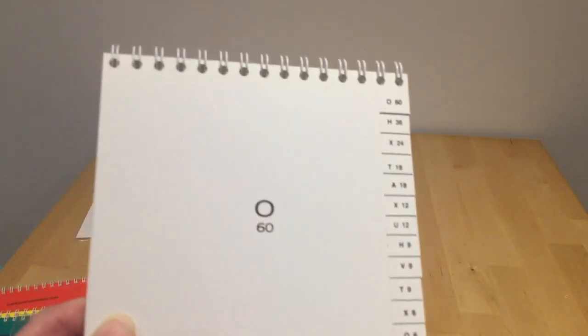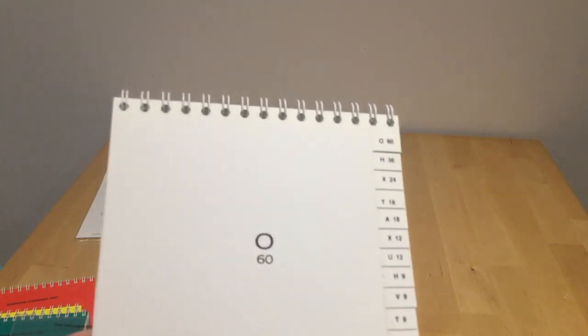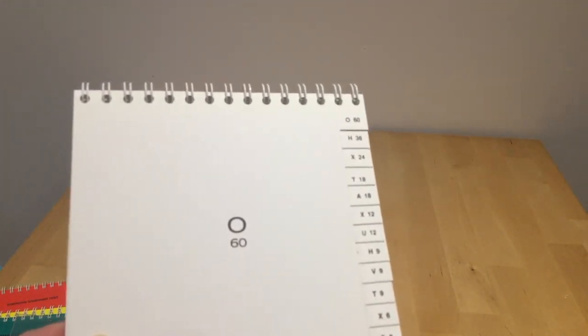So if you don't have very good visual acuity, and you're only going to have one opportunity to guess the letter at 36, it's perhaps quite a crude and blunt instrument to assess distance vision. But that's it. It's the reduced Sheridan Gardner, and only one booklet as opposed to the 3 in the original.